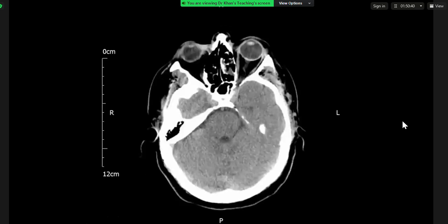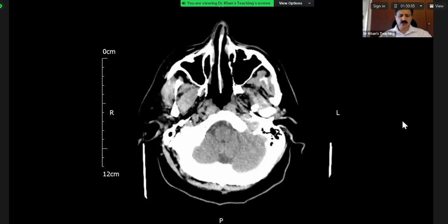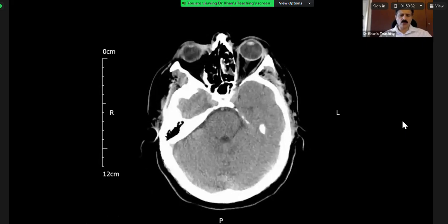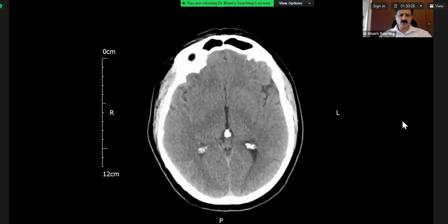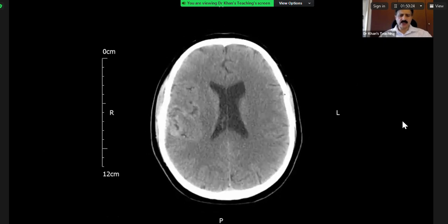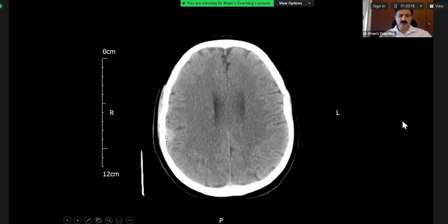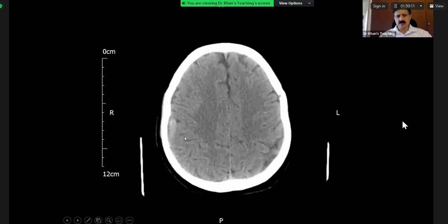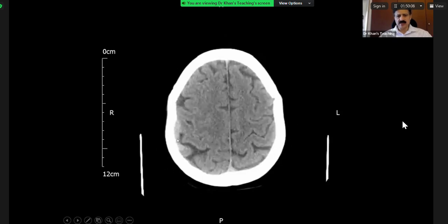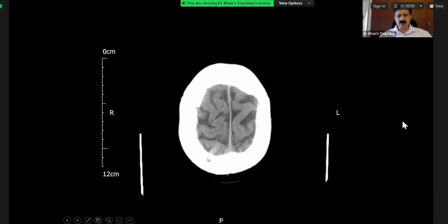Yes, I can. Okay, so I'll take you through this case, and this is the type of case you are expecting in your exam. When the examiner opens it, it's a CT scan and it's an axial slice, and you are going through right and left. Now, if you see here, something has come into the view. Definitely something is there. And on this slice, it is quite impressive, going right and left.